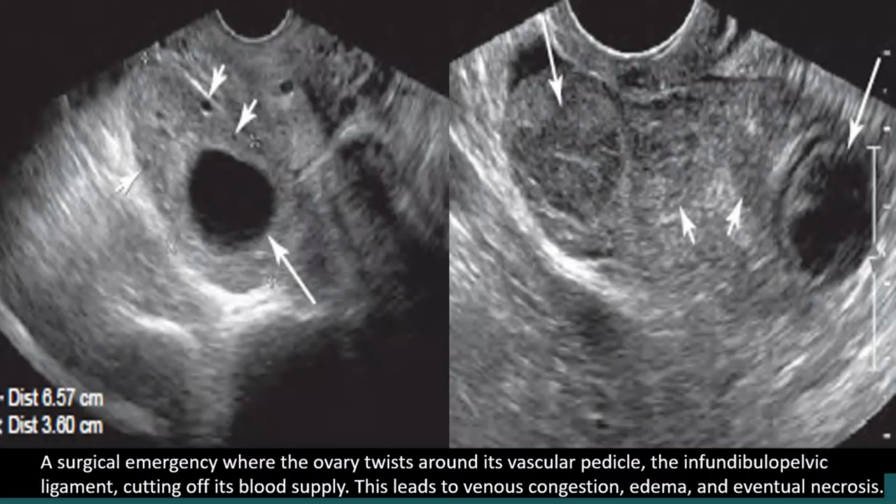The patient with ovarian torsion presents with acute onset of severe unilateral pain, often in conjunction with nausea and vomiting, and there is an increased risk of ovarian torsion during pregnancy. When ovarian torsion is strongly suspected, rapid surgical intervention is important to improve the likelihood of a viable ovary following detorsion. The torsion causes ovarian congestion due to impaired venous and lymphatic drainage, resulting in unilateral ovarian enlargement on the side of pain.